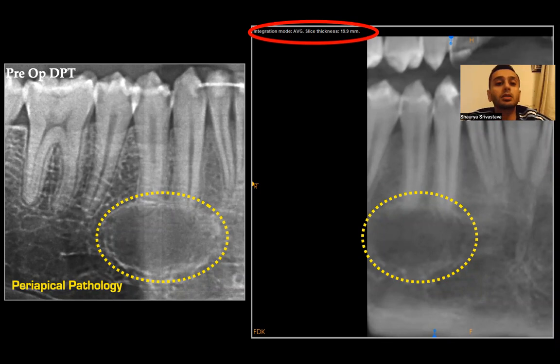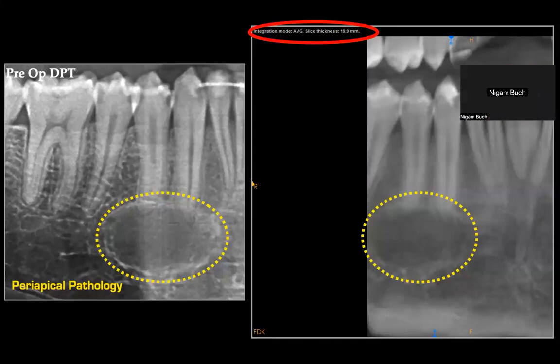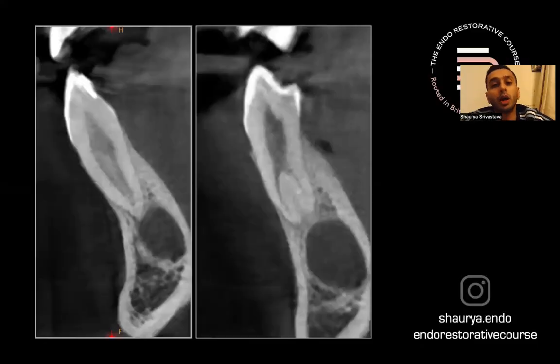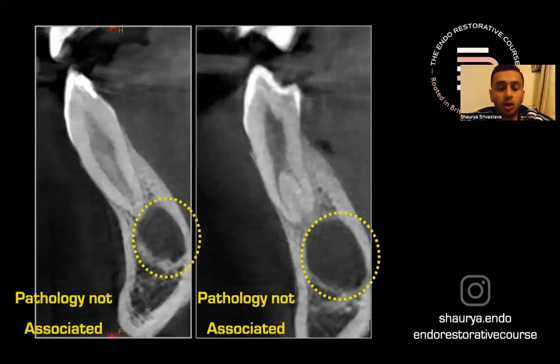All right. So I asked the patient to get me the scan, the CD, and let me view it myself. Regardless, the endo is initiated, but I should still have a look as to why, right? Like what's going on. And when I look at the scan, unfortunately, the pathology is not even associated with the canine nor with the premolar.